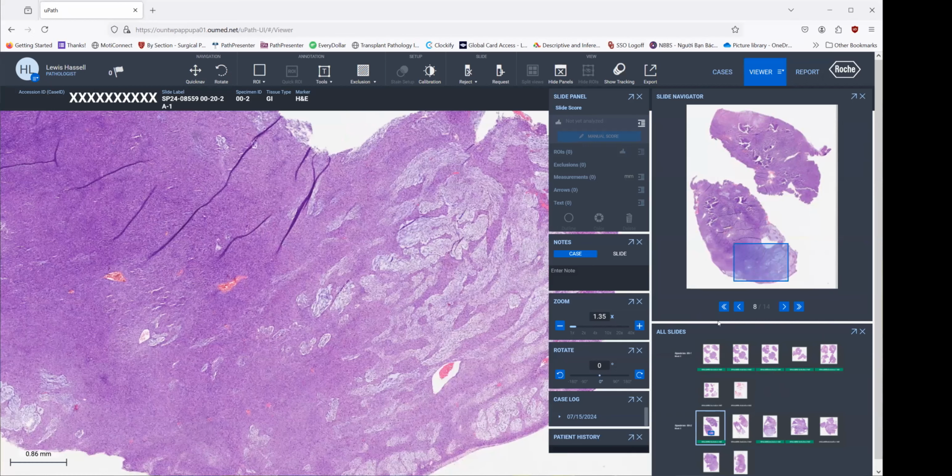You'll notice I didn't do any immunohistochemical stains on this case because this was essentially a debulking to get tumor for that molecular analysis. So we did routine histology, but because the morphology was consistent, because previously we'd worked it up very thoroughly, doing additional immunohistochemical stains for diagnostic reasons would not be particularly helpful at this stage of the patient's evaluation.